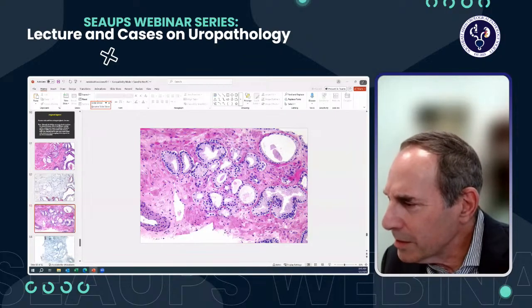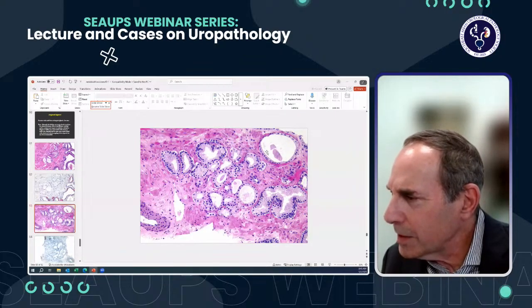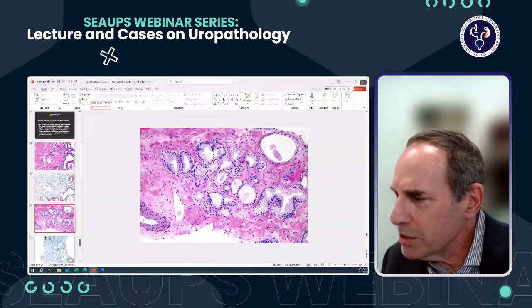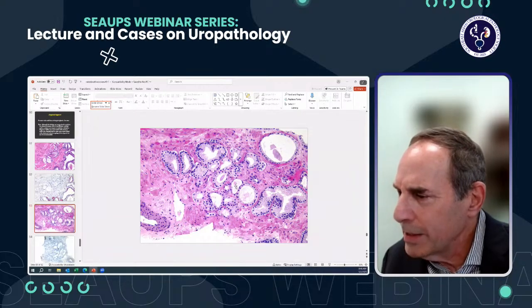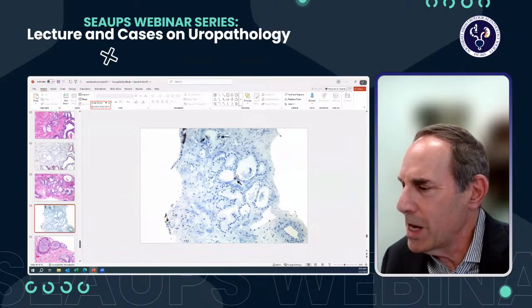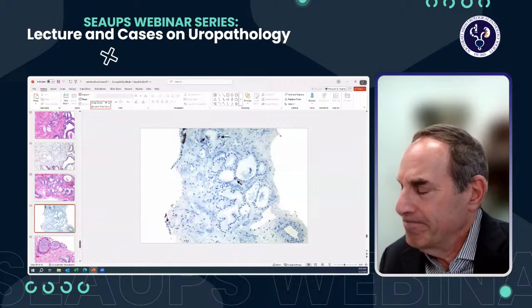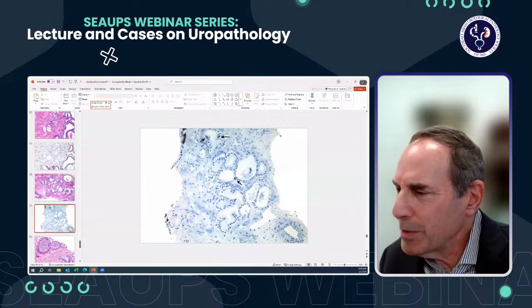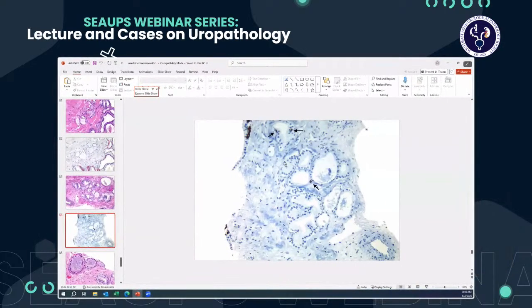Here's another case that's, again, a benign gland here. There's another benign gland upper right with corpora amylacea. See these crowded glands, could be adenosis. Some of these glands have infolding. Some of them are atrophic. Could be cancer too. We go to higher power. There are scattered basal cells. So I would definitely not call this cancer. I probably wouldn't be definitive in calling this adenosis. I'd probably say atypical, favor adenosis, but can't totally exclude low-grade cancer. But again, definitively would not call this cancer.